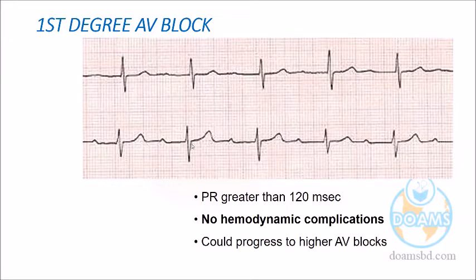So we can say this is PR, but some ECG complexes contain Q waves, then it will be from the beginning up to the Q. So in some leads, we are calculating up to the Q, and in some leads we are calculating up to the R. So rather, to say from the beginning of the P wave up to the beginning of the QRS complex, by definition, it could be a better one.